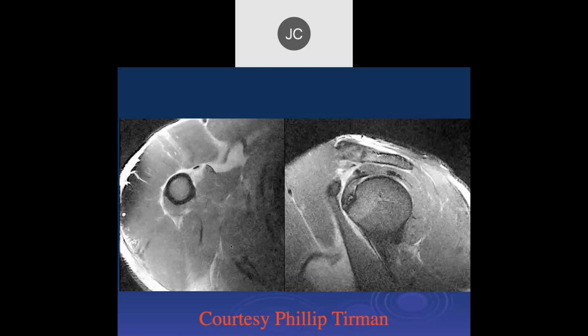So where should the pec tendon be? The pec tendon should be right around here, anterior to the biceps tendon, but there's no tendon there. Is that the retracted bicep or pec? So the pec major is torn and retracted back to here, and here's that biceps tendon with hematoma around it. So this is torn off the bone, so this would be a surgical case.